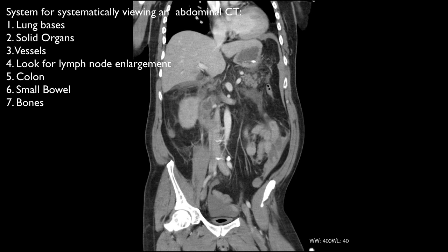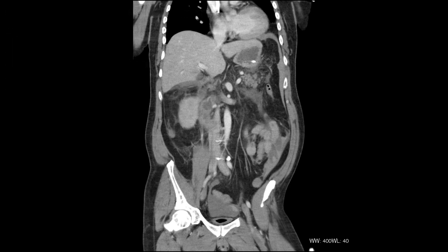And again, with acute abdomens, it's very important to look through for free air, and whilst you're doing that, you can look for some free fluid in the pelvis and around the liver and spleen. There are other little things you might want to do depending on the clinical information. Certainly if you've got a history which might suggest bleeding or ischemia, you'd look very carefully at all the blood vessels, and as well as the arteries, that includes the veins. Sometimes patients with SMV thrombosis can present with abdominal pain. So the vessels are something else to look at. But again, you will slightly tailor what you do depending on exactly the question you need to answer.